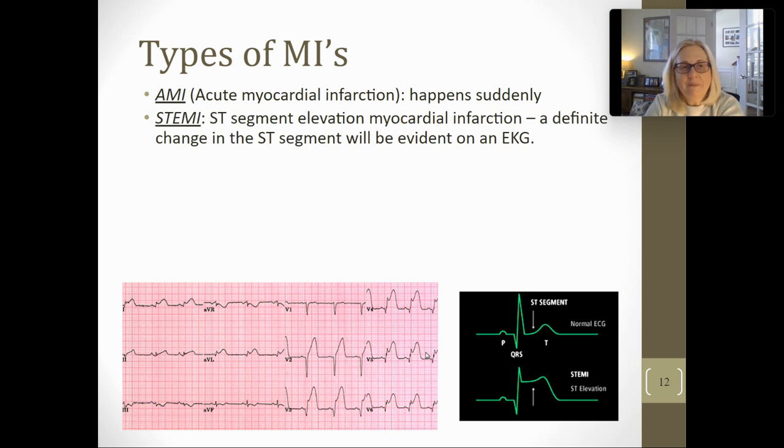A STEMI literally stands for ST elevation myocardial infarction. ST elevation myocardial infarction. So we're taking the ST segment, and you're going to see a definite change on the EKG where the ST segment is well above the isoelectric line. It looks really funky. I'm going to show you several examples, okay?